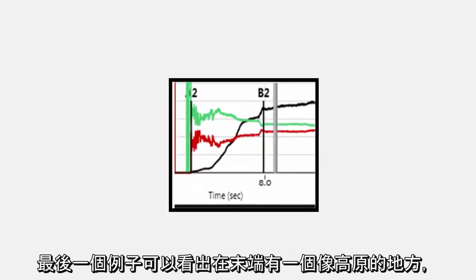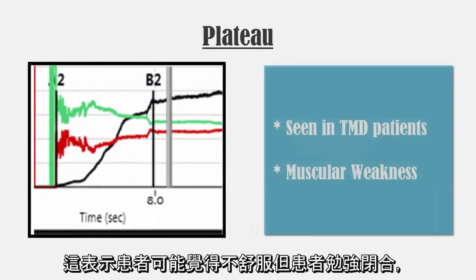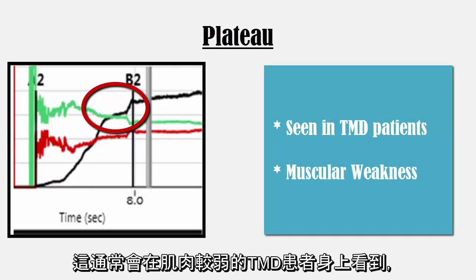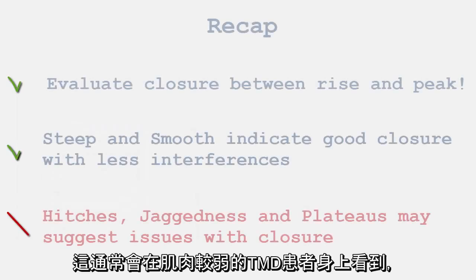The last example shows the black force line exhibiting a plateau, which may indicate the patient is experiencing discomfort and as a result is reluctant to close. This is usually seen in TMD patients who demonstrate muscular weakness.